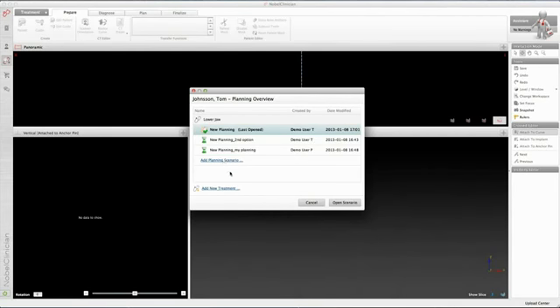In case a new treatment needs to be started, press Add New Treatment. For example, you have made a plan already for the patient's upper jaw, and now you start to create a plan for the patient's lower jaw. This is a new treatment. How to create a new planning scenario or treatment is shown in detail in the section Complete Planning Process.